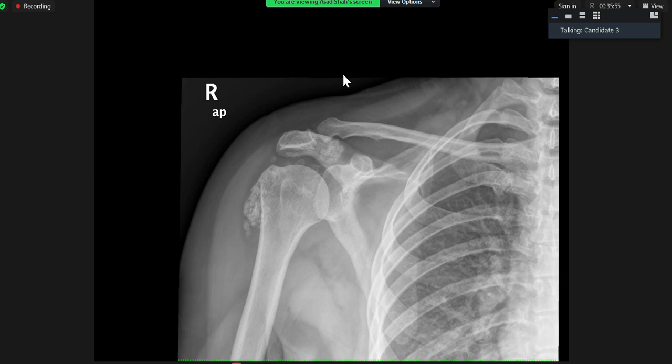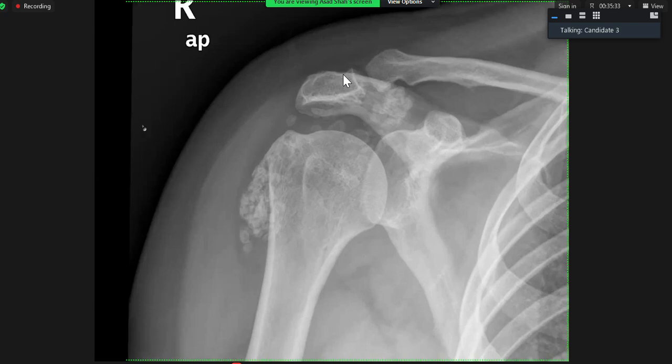It is also extending toward the acromioclavicular joint or distal to the lateral part of the clavicle, and the bones appear unremarkable. I cannot see any periosteal reaction or irregularity of the articular surfaces. These calcific densities show peripheral hyperdense areas with central lucencies. So again, I'm thinking of synovial osteochondromatosis. The other possibility could be a tuberculous arthritis.